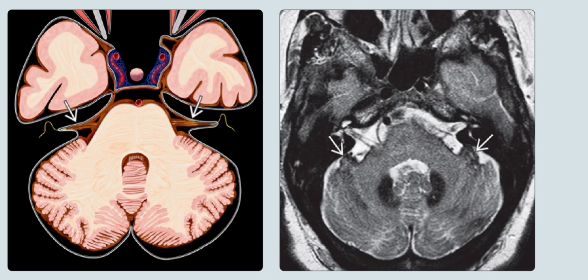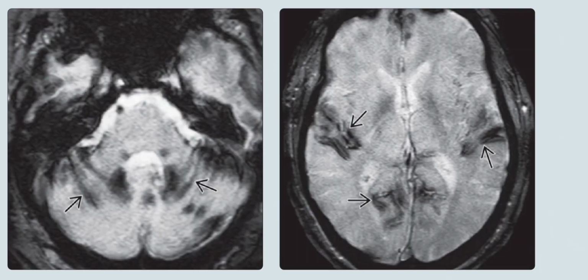Right image is the axial T2 weighted MRI in a 64-year-old female with bilateral sensorineural hearing loss for 3 years, and it shows a thin black line coating the surface of the cerebellum, especially notable over the flocculi. Left is the axial T2 star GRE scan in the same patient, and it shows extensive hemosiderin deposition over the cerebellar folia as curvilinear thick black lines.